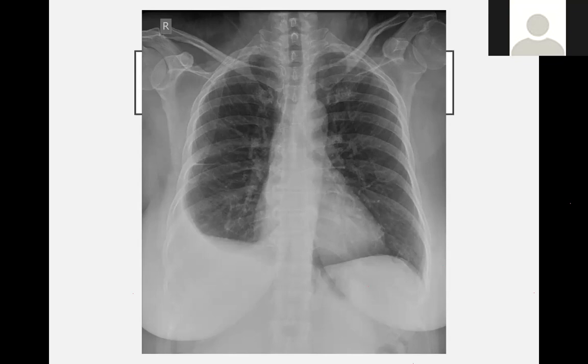And in terms of lung zones and markings, very prominent lung markings throughout both pulmonary tissue, which can suggest some edematous filling in both lungs. And now that my colleague here has reminded me, perhaps it could be said that there could be cephalization of the pulmonary vessels towards the superior end, suggestive of edema below.